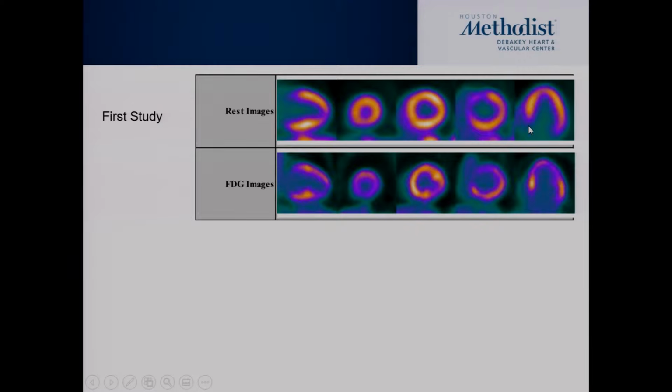So this is, for example, one patient that came to us, and we looked at it, and there was no perfusion defect, maybe a tiny bit in the basal anterior wall. But then when I do the FDG, I see a lot of FDG uptake. That's way more than the defect I see. So we told the patient, and the patient says, yes, I followed the diet. Obviously, all of them admit that they followed the instructions before we start.